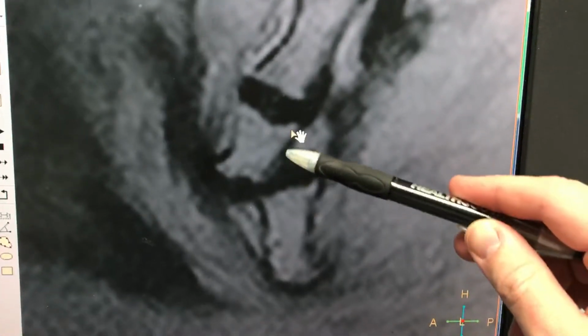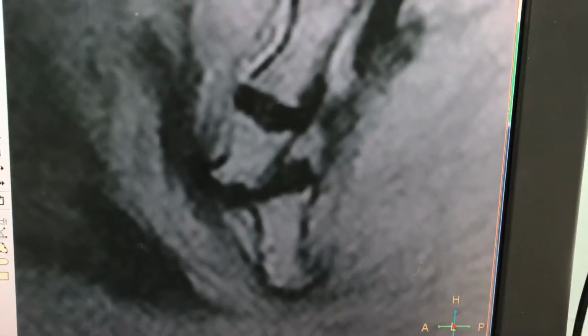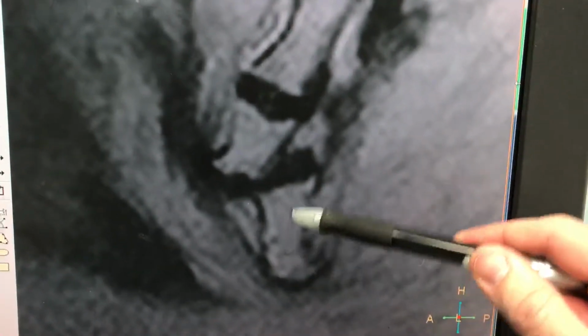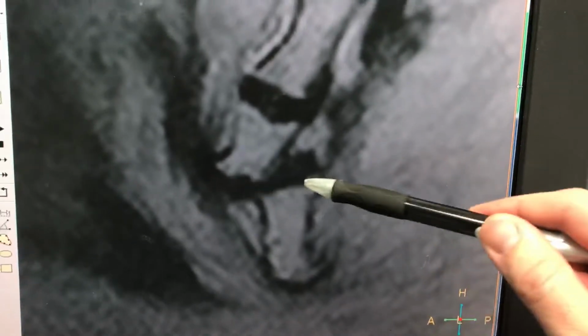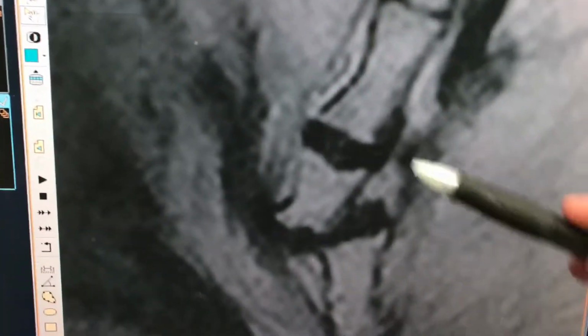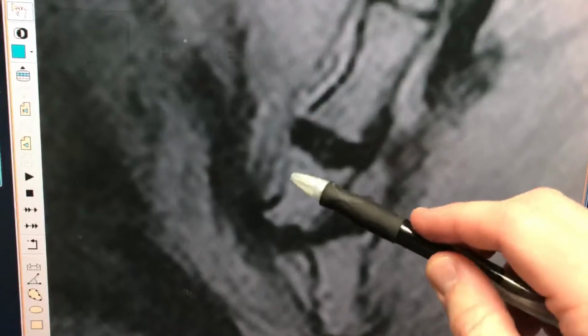So the most notable finding here is that there is a complete dislocation between coccyx bone number 1 and coccyx bone number 2, so at that C1-2 joint space. Normally you would expect one level to be lined up on top of the other, so you can see this first bone of the coccyx is lined up just immediately below that fifth bone of the sacrum.